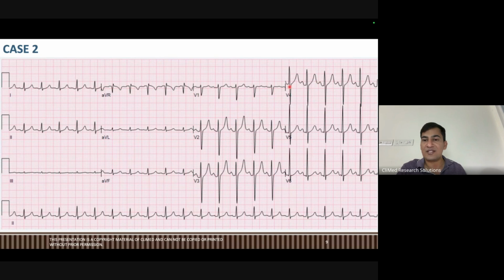If you look at this, this is QRS complex, T, and after the T wave, this is P wave. There are no 2 or 3 waves after T. There is no different kind of rhythm here. Whatever is the pattern, look at the pattern.